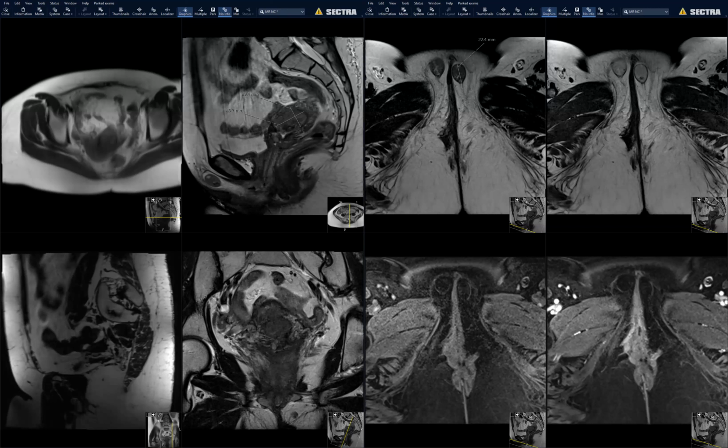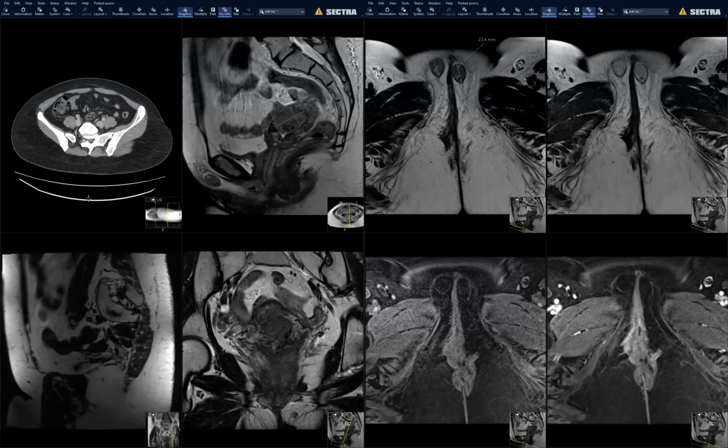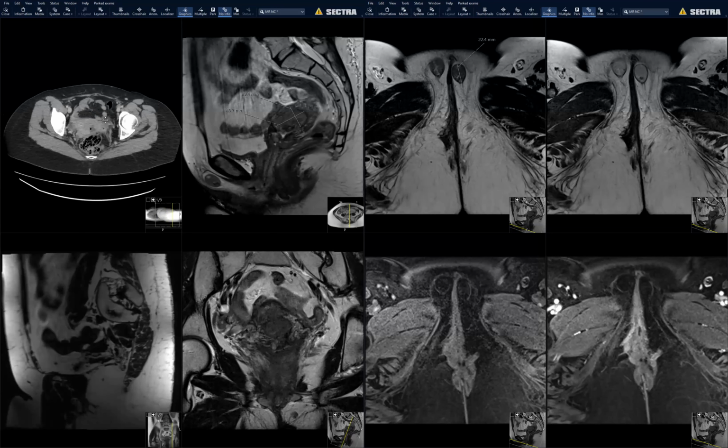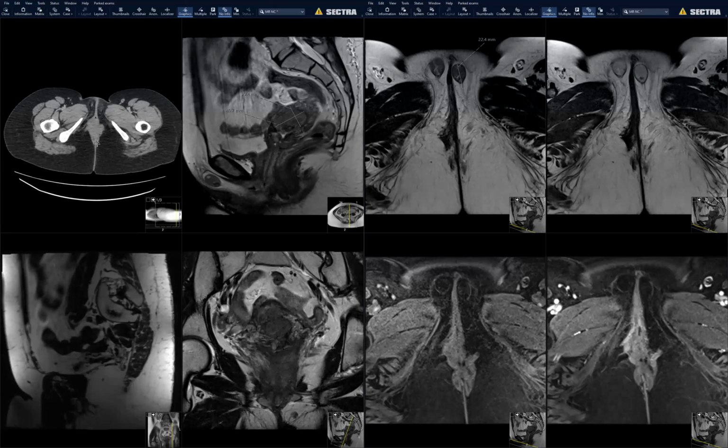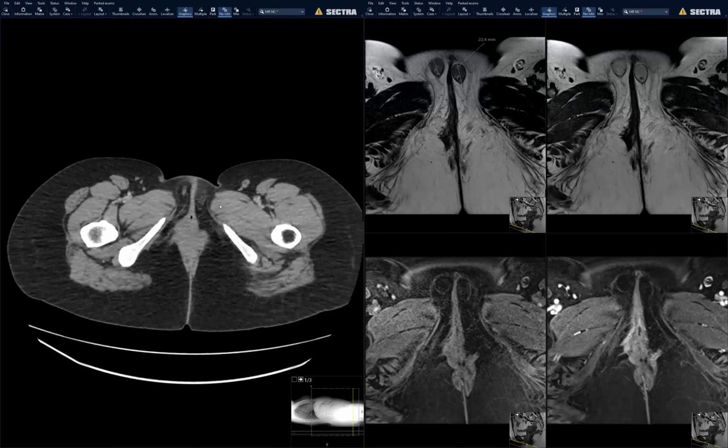It should enhance though, unless you think it's atrophic. It's not enhancing. But it could be atrophic. Yeah, I guess we really did not think about that. We thought about it, but we didn't get any histories about it. Is the location good for a Bartholin's cyst? Or maybe it's too anterior? Look at this. This is all fat. Here's a CT.